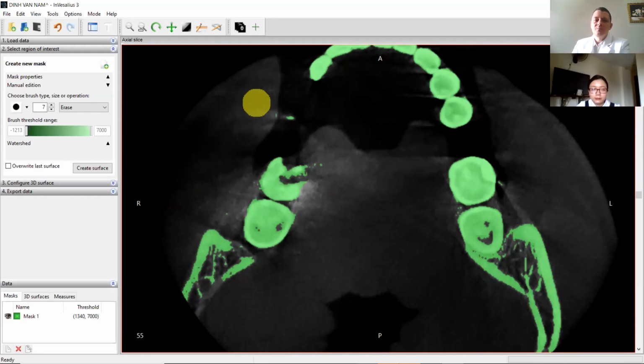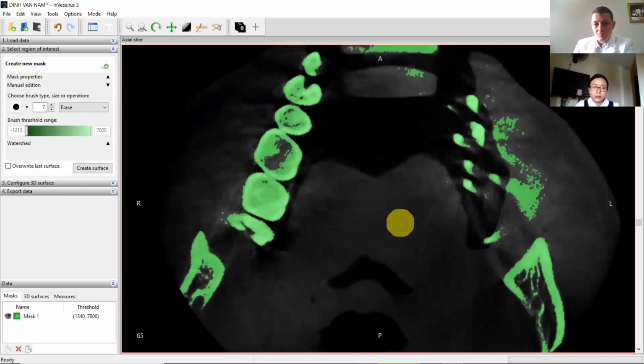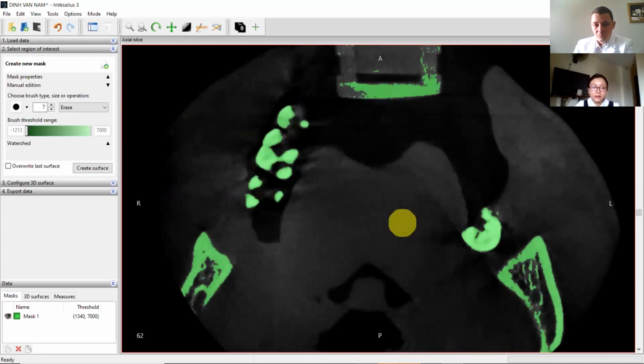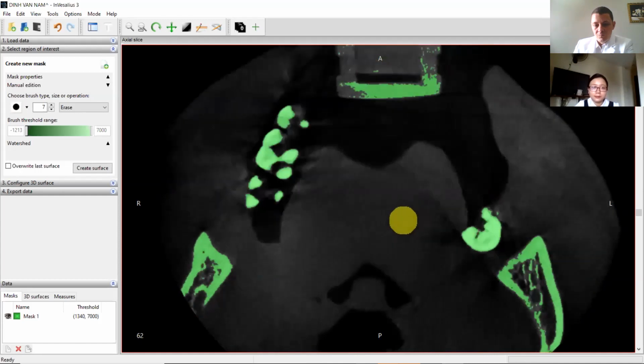Thì bác ấy không có xóa nó đi tại vì là cái phần mềm sẽ biết rằng là cái phần nhỏ đấy nó không có chạm vào cái hàm dưới của mình. So after it will take only the biggest, the mandible. So if it does not touch, I don't care. Thì tí nữa thì mình sẽ chọn cái vật thể mà lớn nhất, cho nên là nếu mà nó không chạm nhau thì mình không có quan tâm.